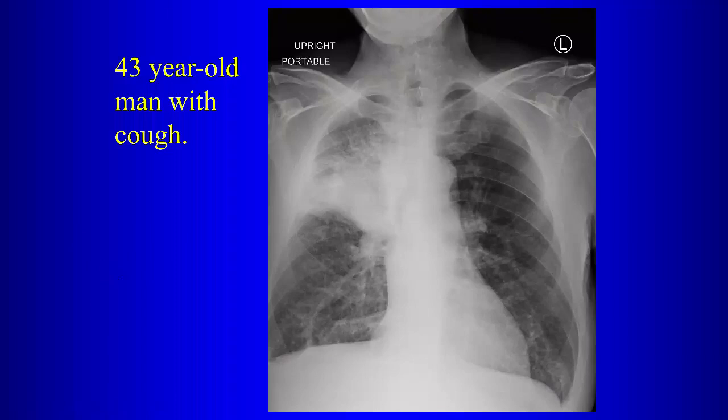What do you think about this case? Right upper lobe. Pneumonia. Or aspiration. That's all you're going to say? Or is there something else you need to mention? CT. Why? Could be a mass. Well, the patient has a cough, looks like there's a right upper lobe consolidation. Why are you worried about a mass? Why can't this be community-acquired pneumonia, put them on antibiotics, send them home?